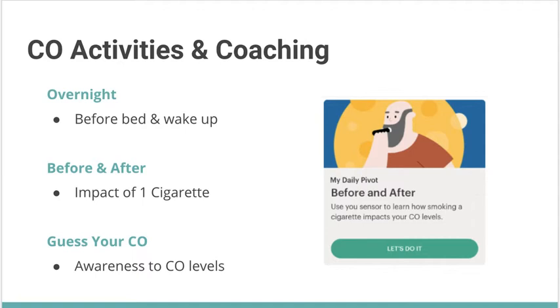Now, the portal also provides each of these CO readings for you, for each of these activities, as well as anytime a user provides a breath sample. So we're going to go over these 3 CO activities. The first one is overnight. It would ask a pivoter to give a sample before they go to bed and give a sample when they first wake up in the morning. And that's actually showing that 4 to 5 hour half-life time.